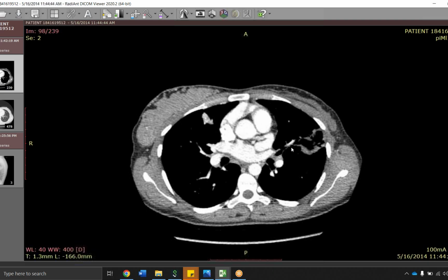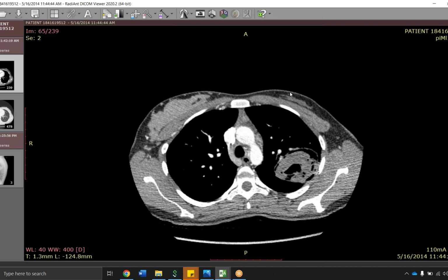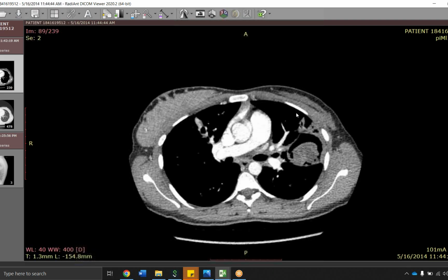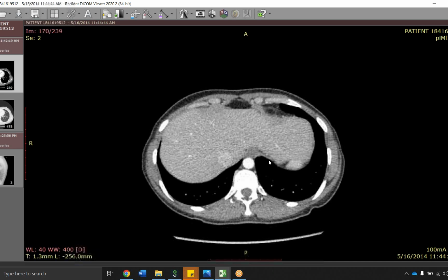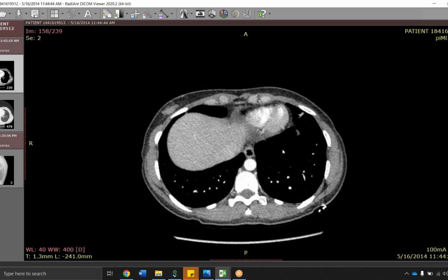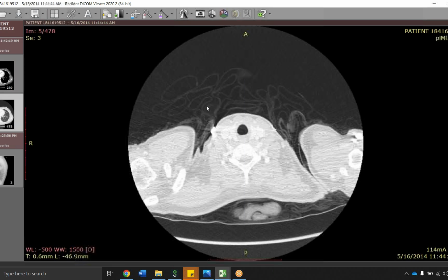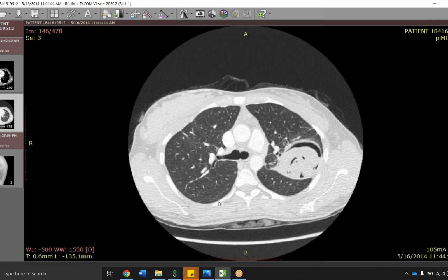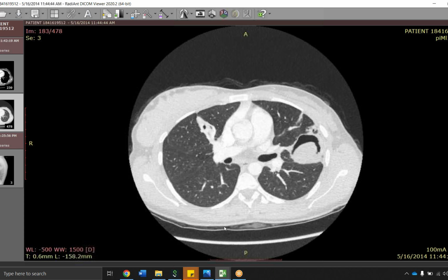It's strange that it leapt to this left upper location rather than being along the right hemidiaphragm, which is typical. And the interesting thing was there was nothing in the liver in this patient. There was nothing intra-abdominally. It was just this one lung lesion. It was very odd. Not a super common infection, but a good example of it.